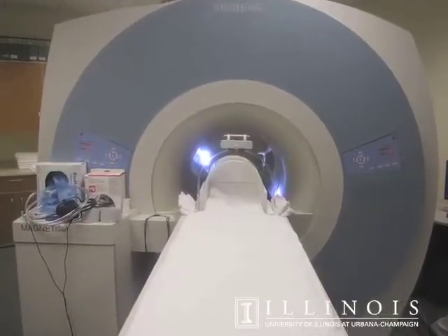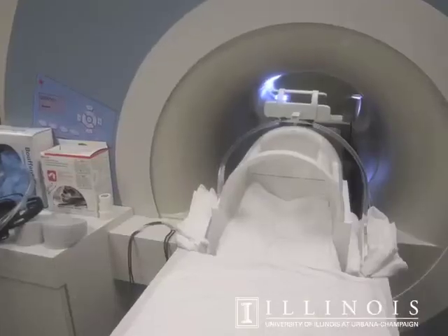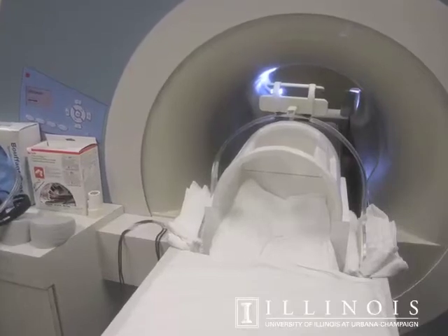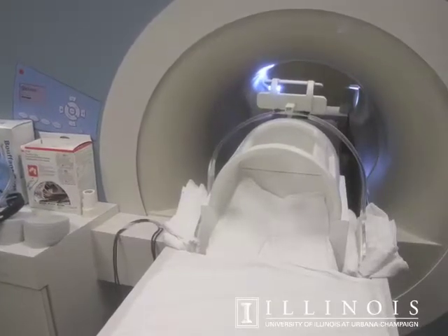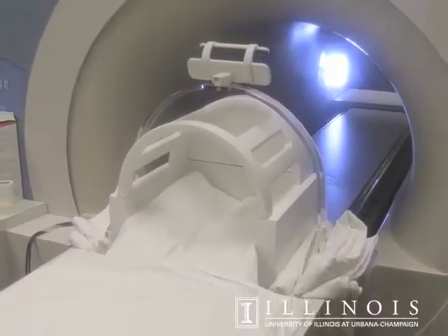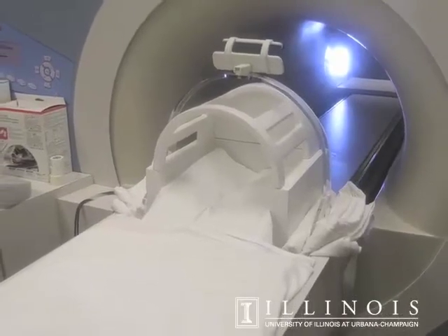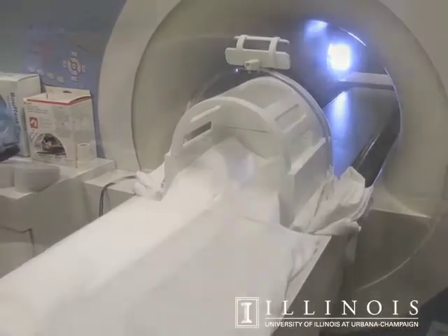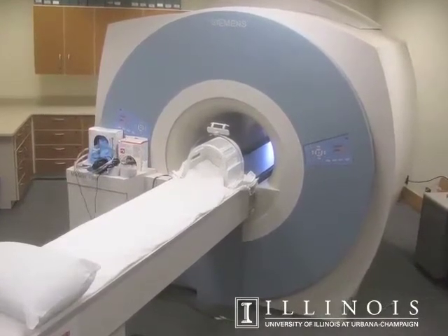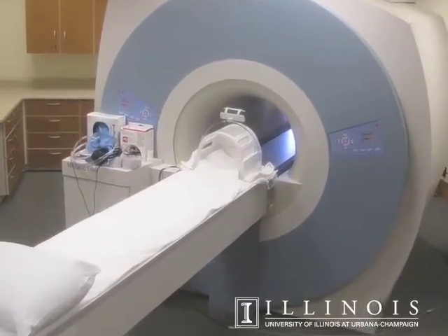So Dr. Sutton, can you tell me a little bit about your future plans for your technology? Yes, we plan on further developing the technology to give us improved images of dynamic motion. We want to be able to see how the tongue is moving, provide a three-dimensional look at how the tongue is moving during speech and swallowing, and make the images faster so we can capture all the motions associated with speech and swallowing. In addition, we would like to further use the technology to study how the brain is communicating with muscles and really see what we can learn about neuromuscular communication.